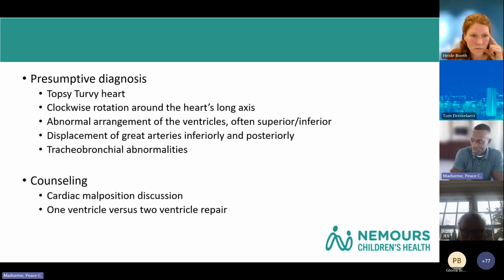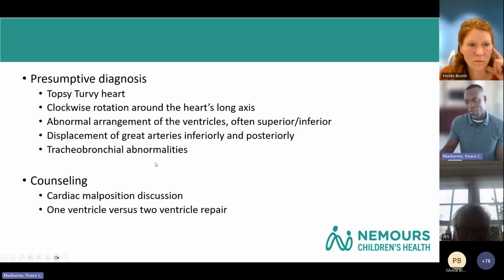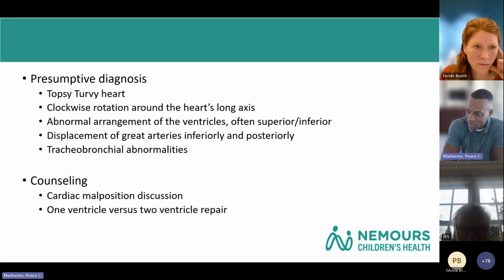I've seen a lot of upstairs, downstairs, crisscross, all kinds of things. I've never seen a topsy-turvy heart. The clockwise rotation around the heart's long axis with the superior-inferior relationship of the ventricles, and then the displacement of the great arteries inferiorly and posteriorly combined with the tracheobronchial abnormalities is what makes this topsy-turvy. It very much impacted counseling.